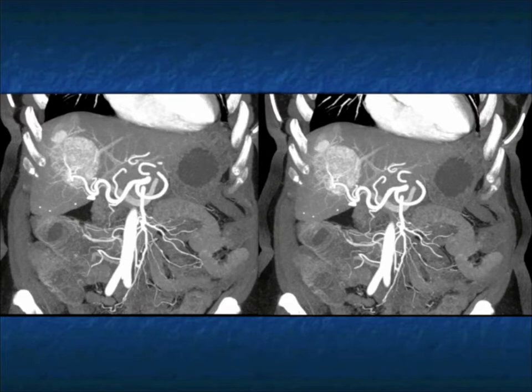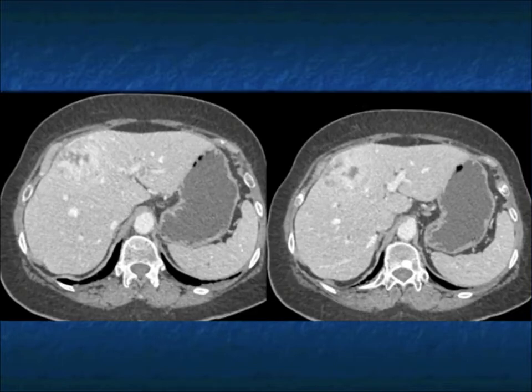Here's again the importance of MIP imaging. I also want to make the point that we talk about arterial phase being critical for the diagnosis. The 3D mapping is very critical. People are showing how when you look at the vascularity, you can predict outcomes. You can predict how patients will respond to various chemotherapies. So that indeed becomes very important as well.